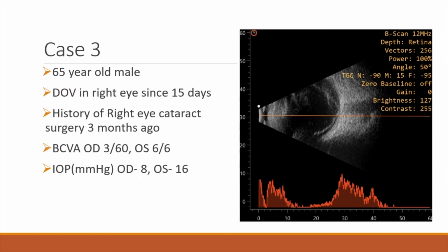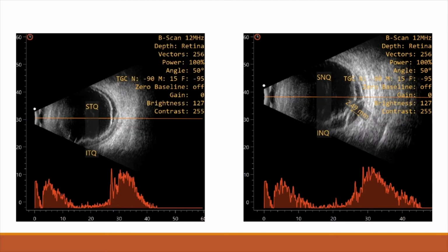And this is an axial scan showing IOL reverberation. And vitreous shows low to medium multiple dot echoes, and we can see that there is a highly reflective V-shaped membrane that is attached to the optic nerve head with low after movement suggestive of retinal detachment. And these are the scans from the other areas.